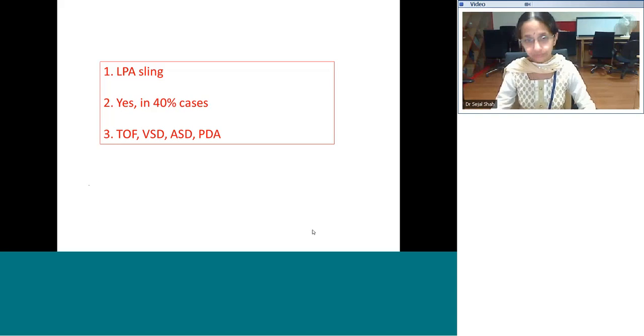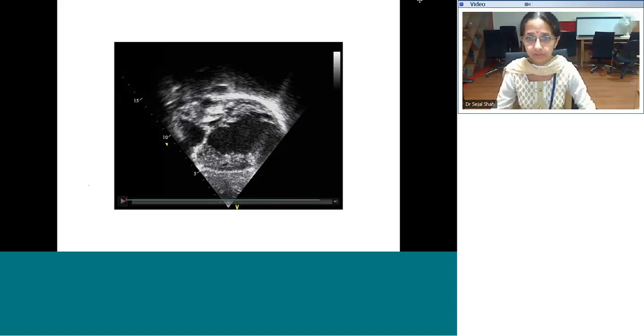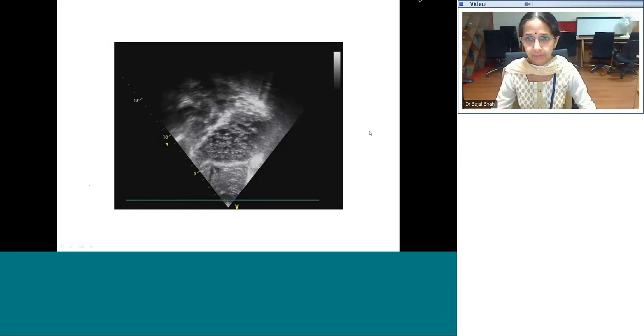So now we go down to the next case. Now I want all of you to see this very, very carefully.